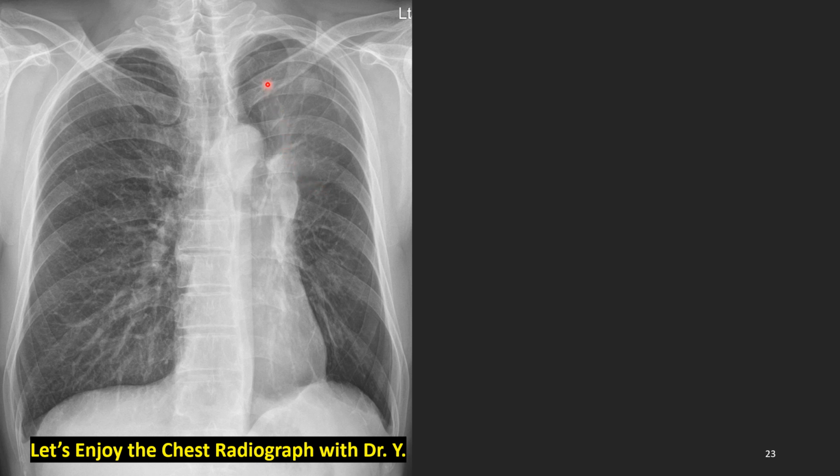Yes. Left upper lobe increased opacity, hilum is increased, hilum margin is obscured, density is increased, upward deviation, and Luftsichel sign here around aortic knob. Aorta line is okay, paraspinal line is okay, left hemidiaphragm is okay, mid and lower lung zone show hyperinflation. Yes, correct. Left upper lobe collapse, atelectasis.